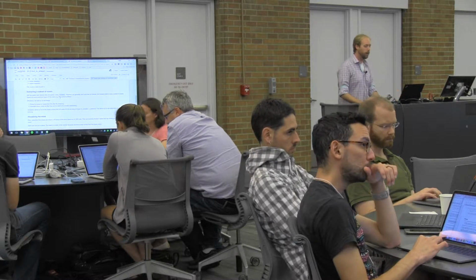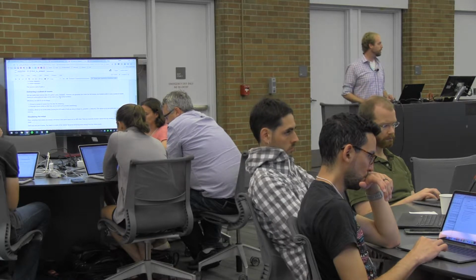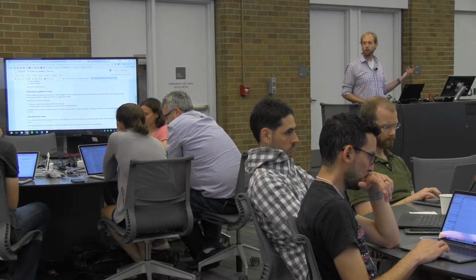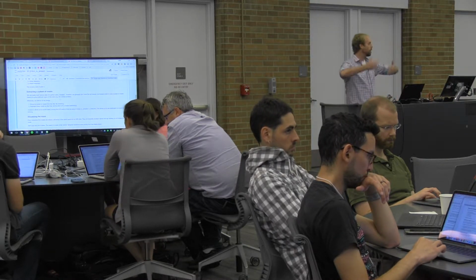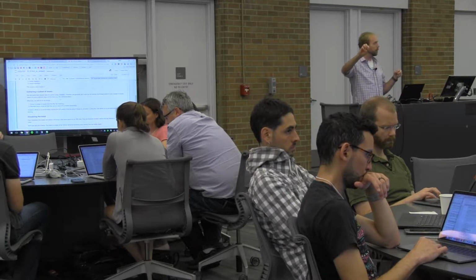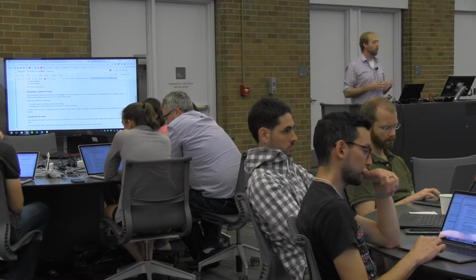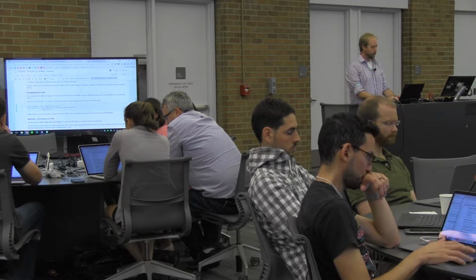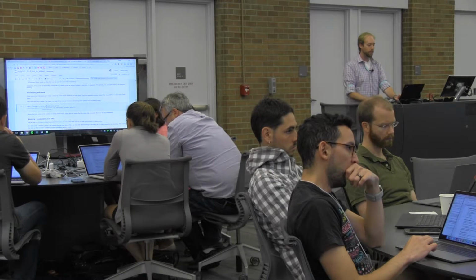So the way that we can do this in nilearn and in the neuroimaging stack in Python is by using some sort of volumetric mask on our data. So usually you say, well, this is the entire volume that I've got, but really I only care about this subset of voxels that are over here, that you may have determined experimentally or based off of whatever question it is that you were hoping to ask. So here, this Haxby data set actually comes with a mask itself.